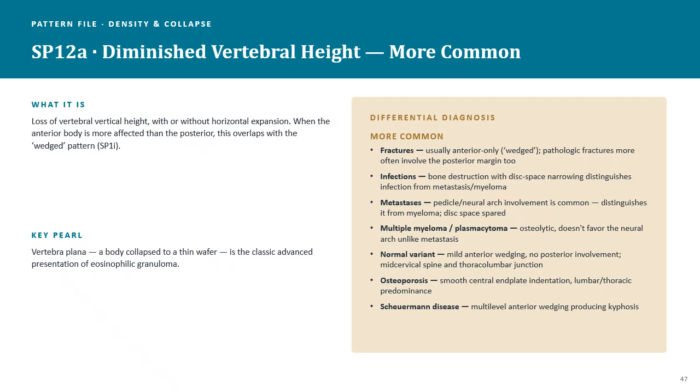If the height is compressed, or if the vertebrae gets compressed or weakened or even destroyed, the height starts to, I'll say, diminish. It starts to squish down and get shorter. One of the most common reasons for a loss in height is a compression fracture, especially in patients that have osteoporosis. Mainly, the front of that vertebra collapses, so it starts to become more of a wedge shape. And we talked about that wedge shape a little bit earlier.